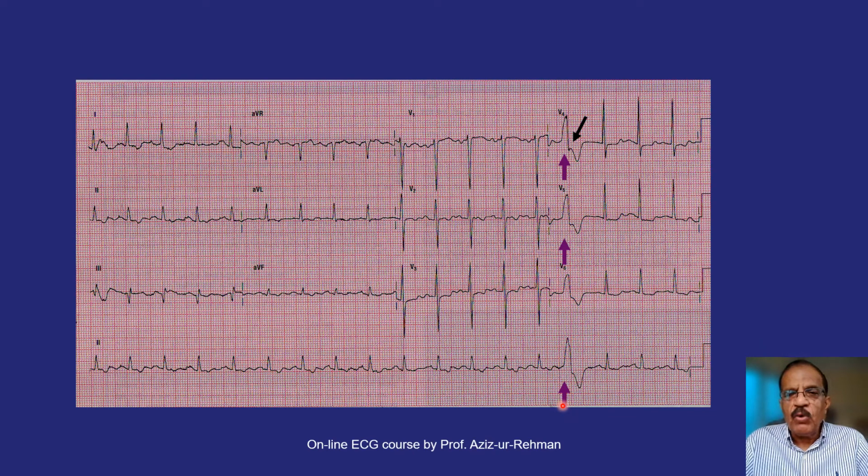There was an ectopic activity arising from the ventricles which depolarized the ventricles, and while the ventricles were depolarized, a sinus beat came. It did not penetrate into the ventricles because they were already depolarized, so it only manifested in the form of a small P wave, not followed by a QRS complex.